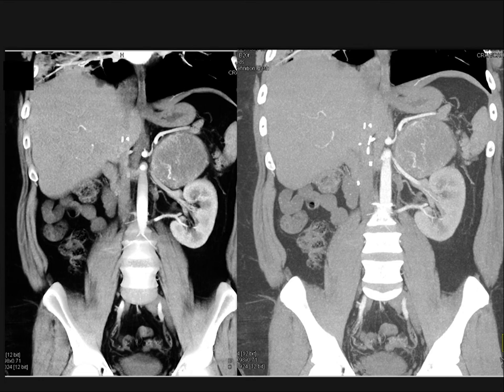Now, if you look at this mass, and forgetting everything, if you only had the adrenal circled in, it could be a pheo. It's a large mass, some vascularity, could be a primary carcinoma. Lymphoma, usually bilateral, though usually not very vascular, but I couldn't exclude it. And in theory, it could be metastatic renal cell carcinoma, right? Because it's a solid mass, and any mass can be metastasis.